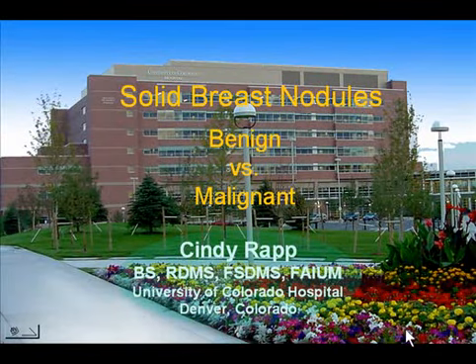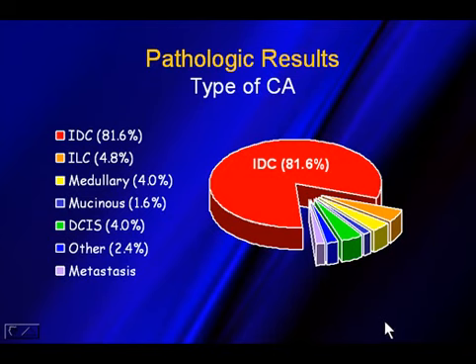Solid breast nodules, benign versus malignant. If we look at the type of cancers that we see with ultrasound, the number one cancer that we'll diagnose is invasive ductal carcinoma. You can see the second most common is invasive lobular. We also have medullary, mucinous, DCIS, and other types, including metastasis. DCIS is much more common in the mammographic role, but with ultrasound, we typically will find invasive ductal cancer most often.